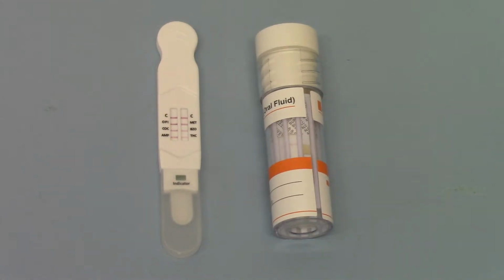Well, welcome to this video demonstration where we're just going to talk you through what faint lines on a drug test mean and the implications for those in terms of how you read your results, but also why they occur and why there's variance between the different tests on particularly multi-panel saliva drug tests where you've got a single membrane with multiple tests embedded into it, but also on the single test membranes in the peripheral type devices.